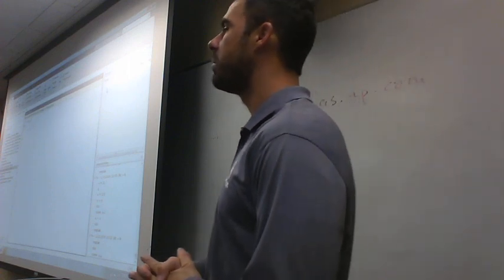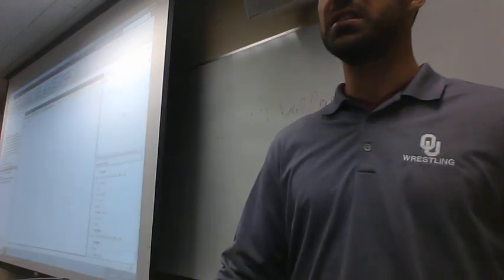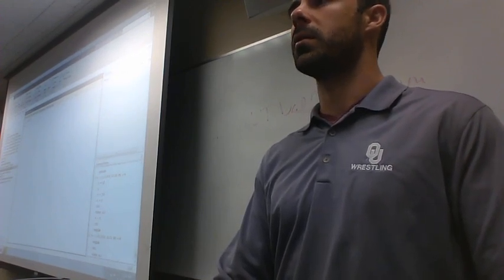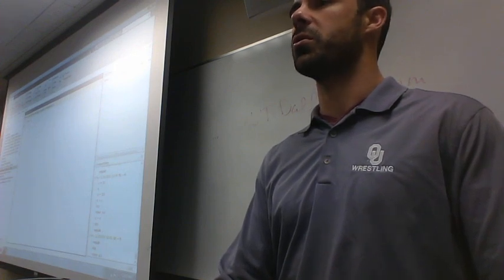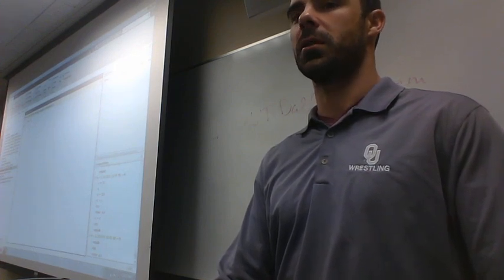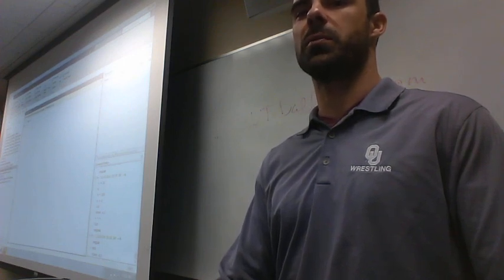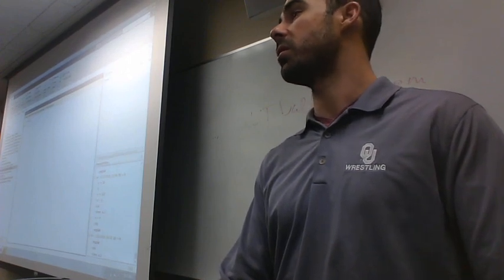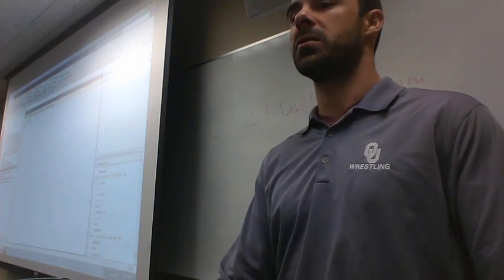Sometimes it's helpful to do that on different occasions, and I'll show you a couple small, easy things we can do to make this stuff a little bit more accessible and easier. So one thing we can do is we can create some shortcuts. Notice we have all these little shortcut buttons up here. We can add them and we can make them ourselves. So these are just little tricks that I like to do that help me process data that I figured you might like too.